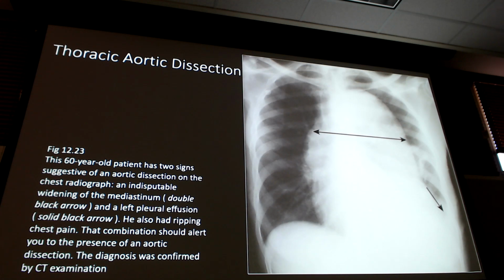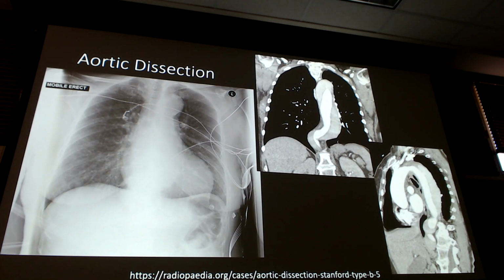Okay? So this is that same one from before. The reason it was so large is this patient actually has the dissection, but I didn't say that then because I want you to see the x-rays look exactly the same. But now look at my CT with contrast. X-ray, I can't really make a whole lot out. Heck, even this one here, I have a little bit of an enlarged aortic knob, but it's not super prominent like some of these other aneurysms and dissections we've already been looking at. So I'm not really sure. Why did I suspect this? This patient reported that tearing, ripping back pain.